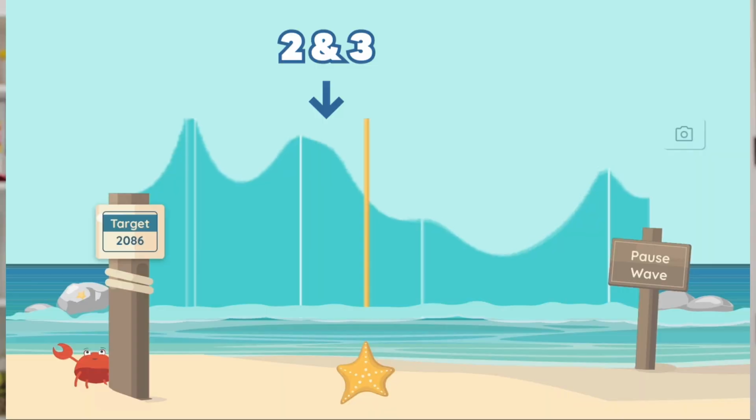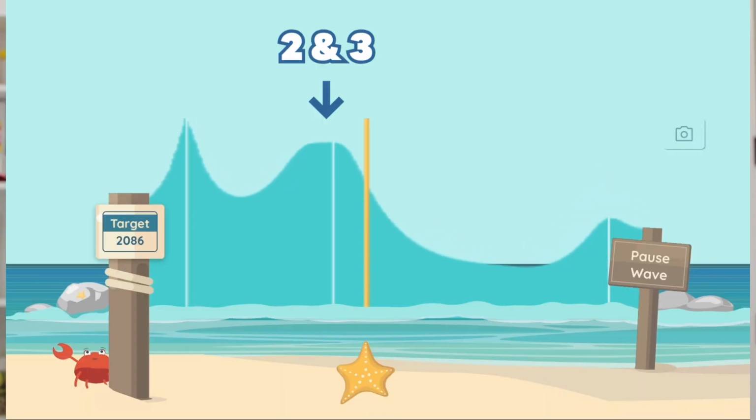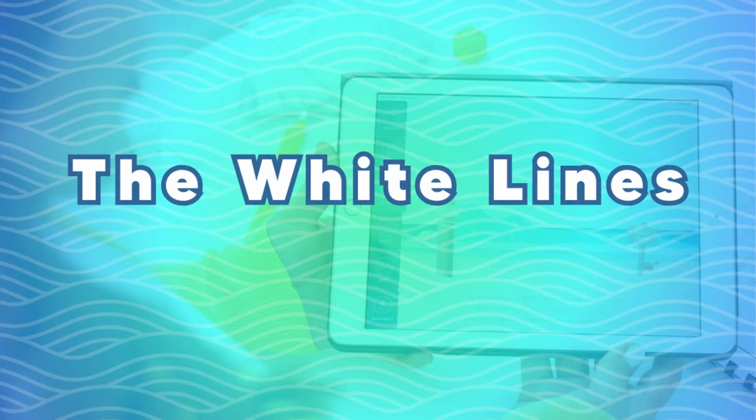Now, sometimes in a really accurate R, the second and third peaks can merge into one. And that's actually okay. The key is that the highest point of the merged peak still lands near the Starfish Slider. That's your visual cue that you're moving in the right direction.